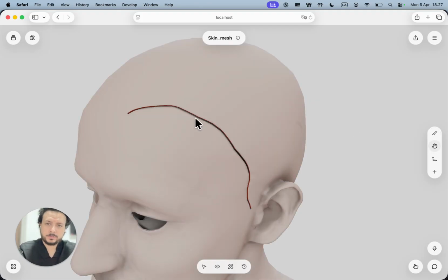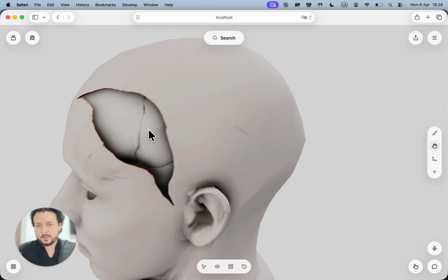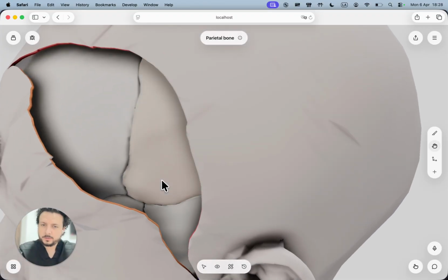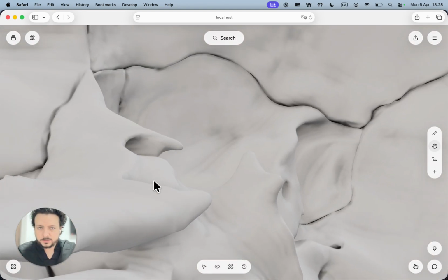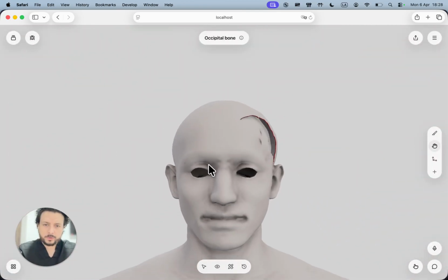Perform the incision, we can plan for the retraction, and we can see if it works for us for our approach or not to reach the areas of the brain that we need. We can even fade certain bones to see inside, to see if it matches the area we need to work in. We can also apply it for different parts of the body.